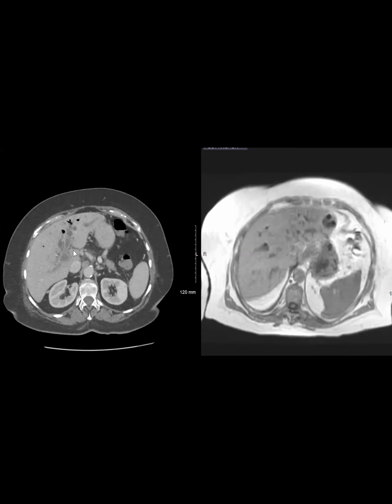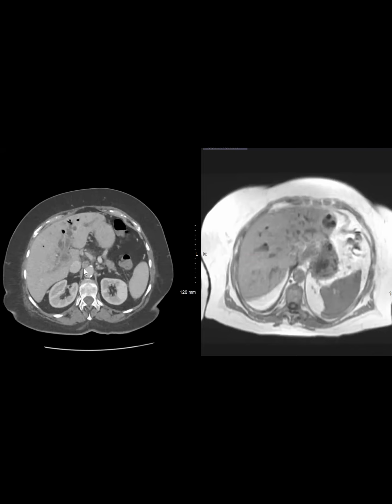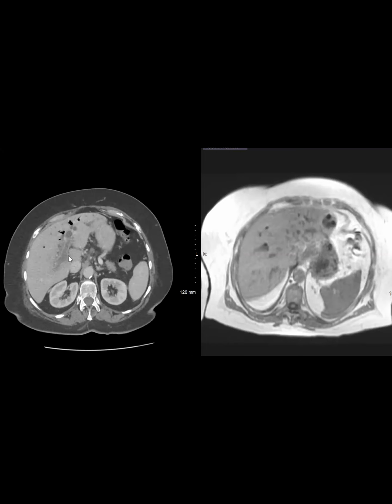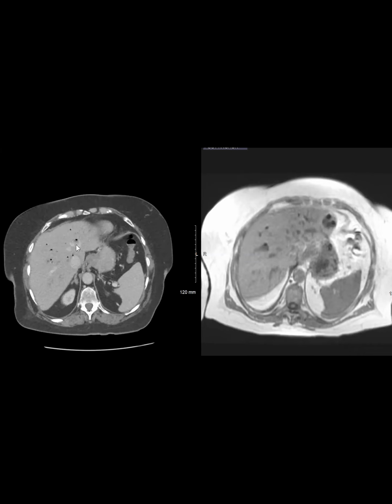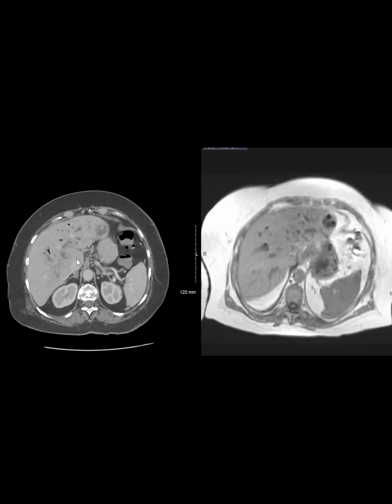Right. So this is acute, acute thrombus can be expansile. Okay. And sometimes it's hard on a single phase CT. Like if I didn't give you anything else, it would be difficult to say for sure for this image if it is a TIV. But it's a clinical context, right? We have cholangitis, we have an abscess. And right there, on the wall, I feel like you can see the bile duct also communicating with that biloma.